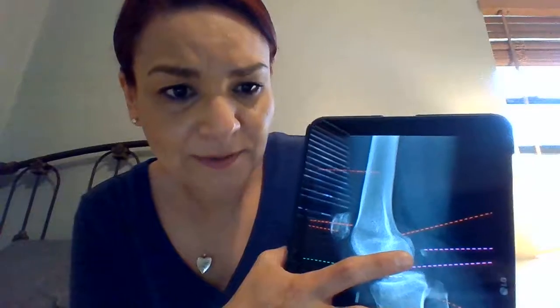I know it's kind of hard to tell, but you can actually see right here. You can see my TV in the screen. Let me go and turn that off. You can see here this white speck in the posterior aspect. That's actually calcification there.